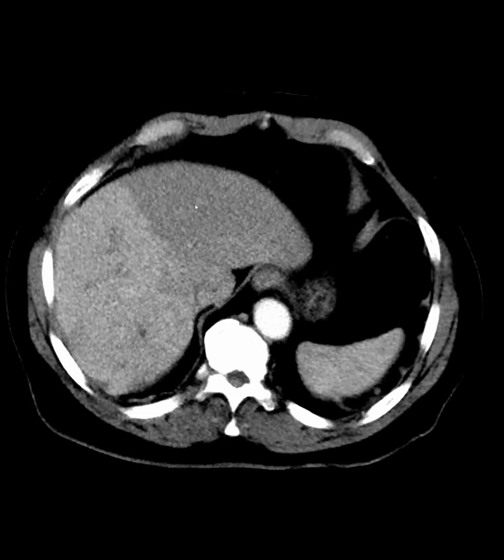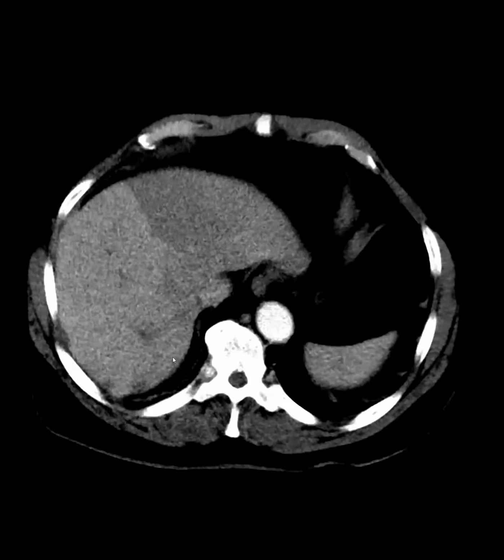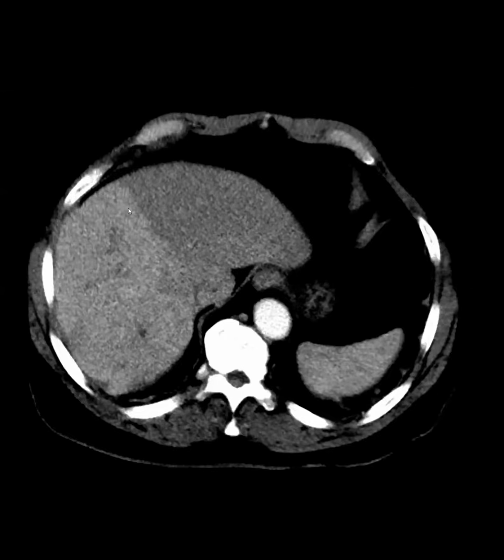If one side is bright and the other is not, then the bright side is abnormal? Is that what you're asking? Yeah, which one are you more concerned about, the bright side or the dark side? The right liver looks bright, and because it's lobulated. Forget the lobulation. If it looks completely normal and one side is bright and one side is dark, what are you more concerned about? I don't know. Okay, that's my trick question.